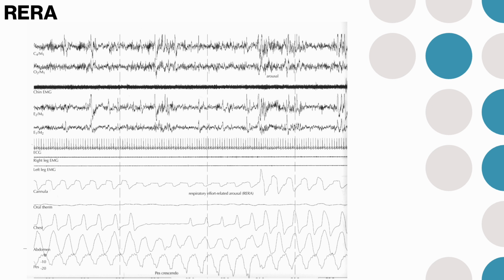It has to be an arousal because it doesn't have to be 3%. If it's 3%, that could be a hypopnea. Really, I think the reason we have RERAs, other than these instances where there are true RERAs, is that Medicare and Medicaid don't allow these kinds of events if they don't have a 4% desaturation. Then you can score it as a RERA. Although RERAs don't factor into the AHI, they do factor into the RDI, the Respiratory Disturbance Index, and sometimes doctors can massage that into getting a treatment.